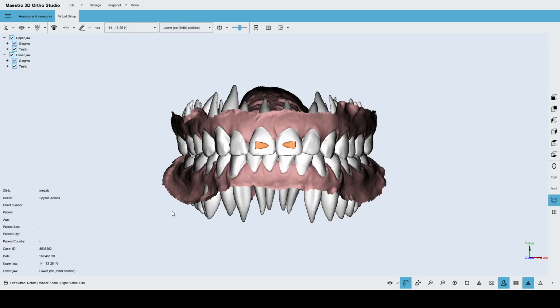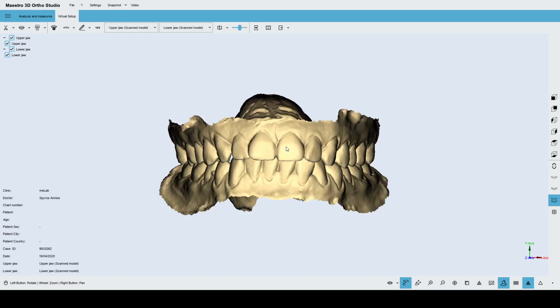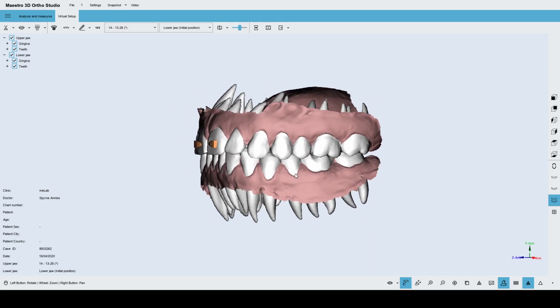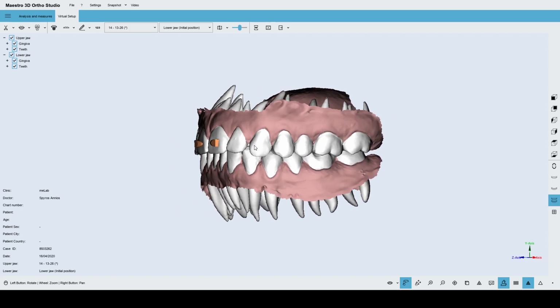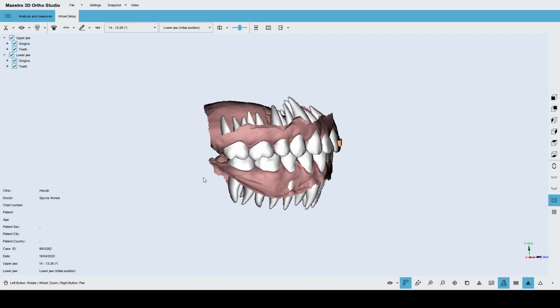And right now I have the sequence of models obtained for this particular case. And now the last step will be to prepare the models for the exporting, and we will finish our presentation.